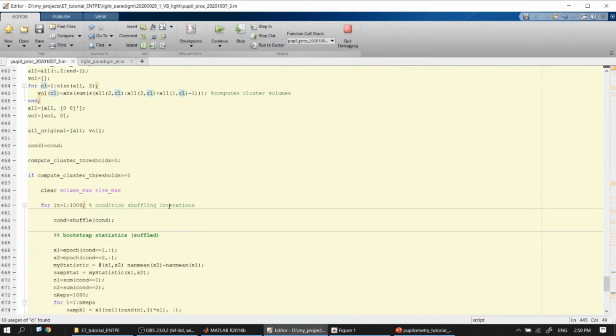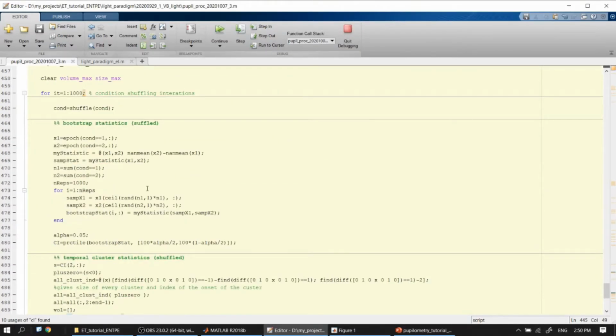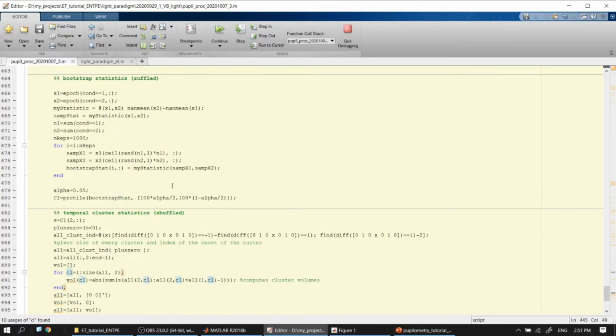And this kind of approach is not very fast. It takes some time to be computed, because you do the Bootstrap 2 times.